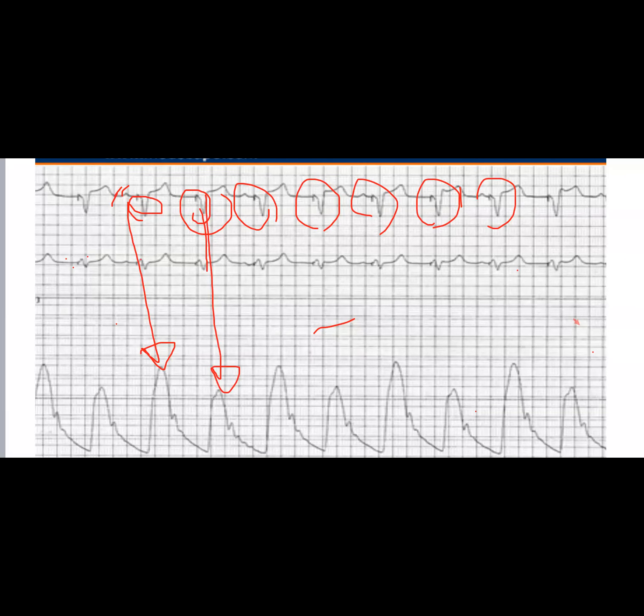So this looks like pulsus alternans, but it's not. It's the effect of a pacemaker with intermittent appearance and disappearance of the A wave. So when we have the A wave, we have more amplitude. When we don't have the A wave, we have less amplitude. And that is commonsensical because we know that the atrial contribution is like 30%. So when we lose 30%, we get lesser height. So though it looks like pulsus alternans, it's the influence of the pacemaker. Okay.